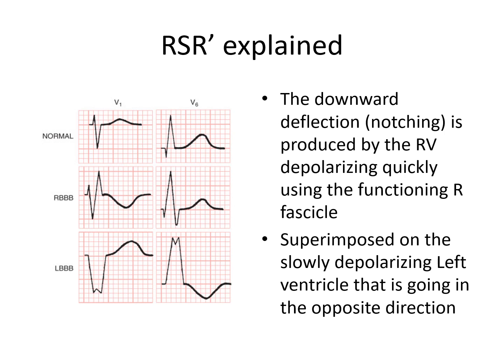Again, why do we get the notching that we do in the left bundle, that small notch on top of the QRS that's usually mostly visible in leads 1 and AVL? Well, again, remember that vectors are additive, and what's happening is the fascicles that depolarize the left ventricle have died, so it's taking a long time for the left ventricle to depolarize in the leftwards direction.